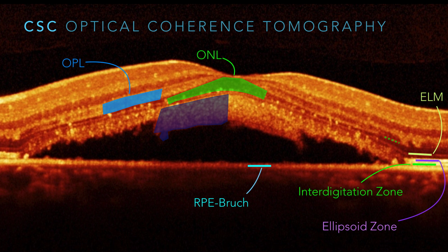and to me this represents some fairly healthy photoreceptors. They're still making outer segments, they're still getting some nourishment. It's when they stop making the outer segments that I get more concerned about photoreceptor health and permanent irreversible loss.